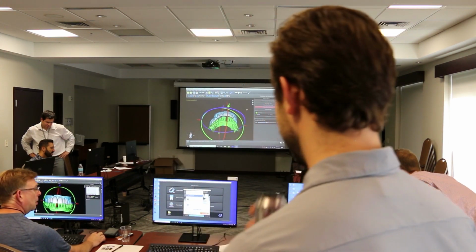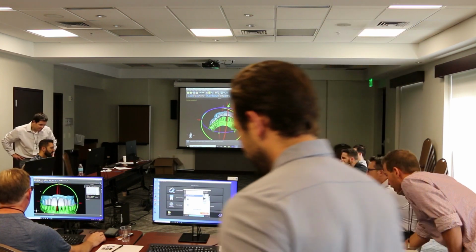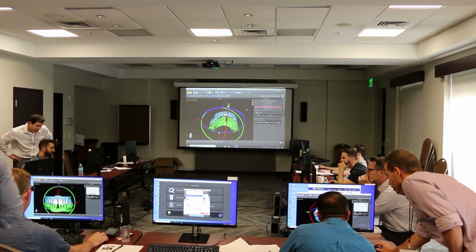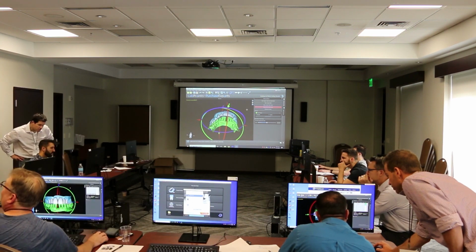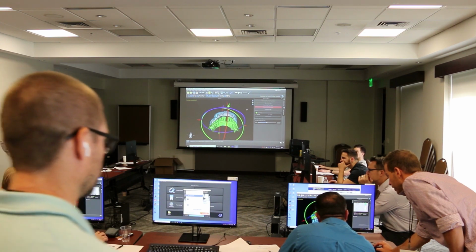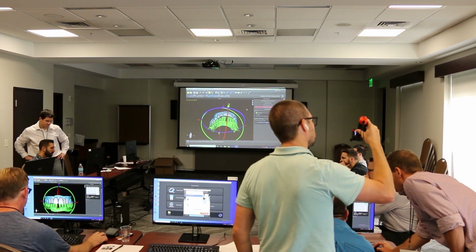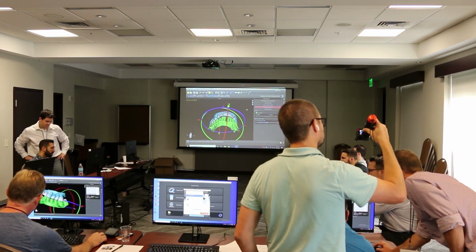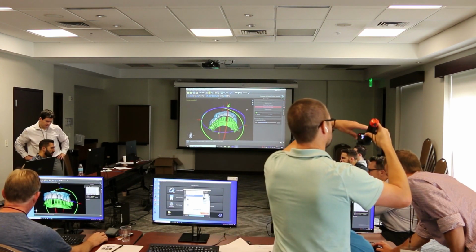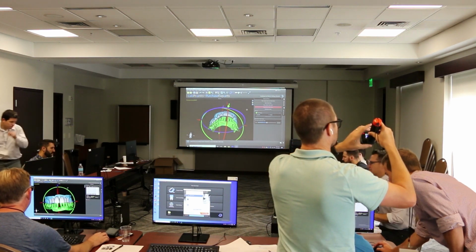Oh, okay. So what you want to look at is you're really starting with 8 and 9 in mind, getting them close here. Class 1. Yep. Class 1. And then you're looking at occlusal plane is fairly even here. So you're close. You've got 8 and 9 lined up, and you got occlusal plane. Now you can see it's too narrow, right? This arch form is too narrow for this patient. So we're going to jump to that in a second. But you're pretty close here.